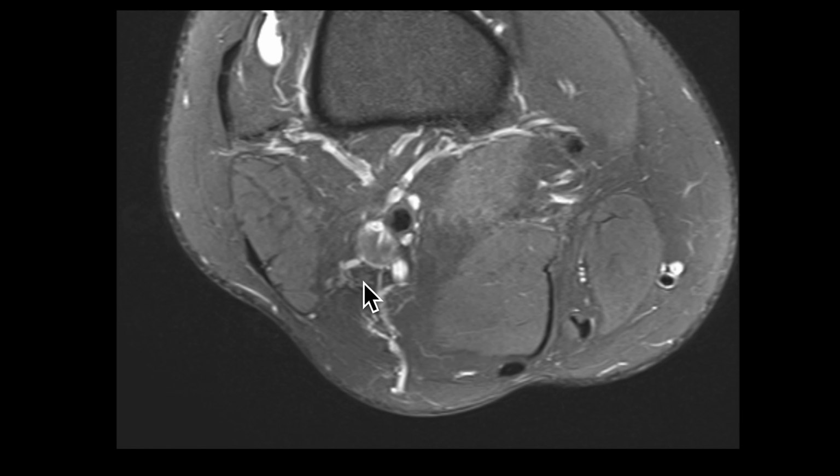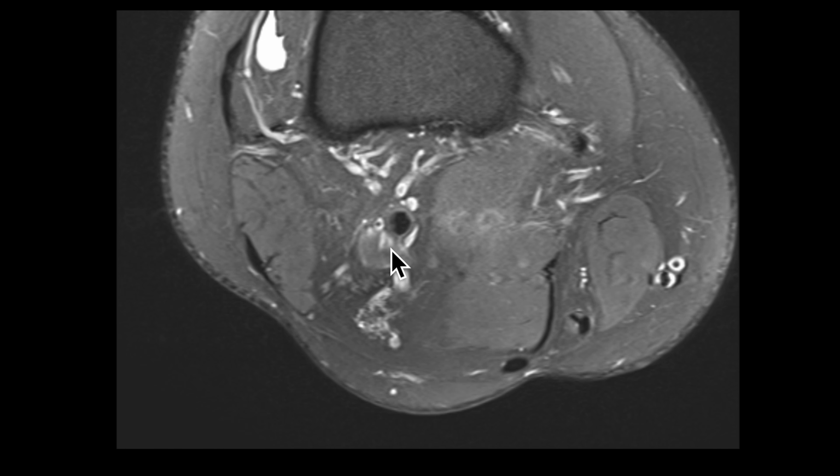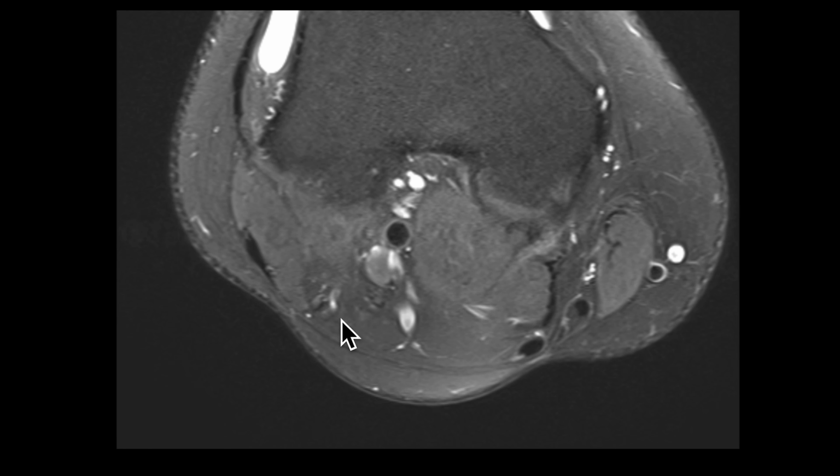This is normal signal intensity for nerves, whereas when you have nerve pathology, you're going to get fluid bright signal. It starts to mimic joint fluid or fluid in the adjacent vessels. That will be abnormal. Sometimes you'll get abnormal thickening of the nerve, edema surrounding the nerve, and in rare or unfortunate cases, you can actually see complete disruption of the nerve fibers.